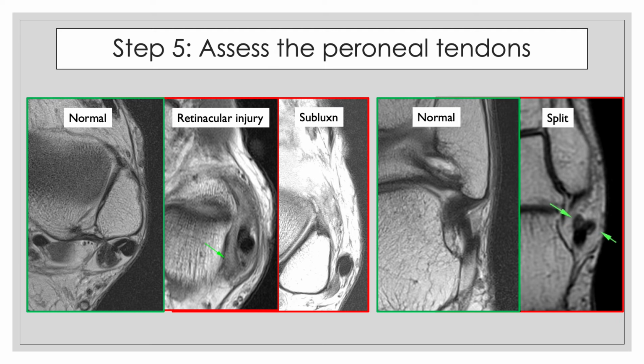But other than from the peroneus brevis attachment, you may see a peroneal tendon sheath injury because the tendon pulled against the sheath and the sheath gets stretched. You may have the sheath tearing and the peroneal tendon subluxing out. So instead of being posterior to the fibula, it moves lateral or anterior to the fibula. And then you may see the tendon itself develop splits inside it.